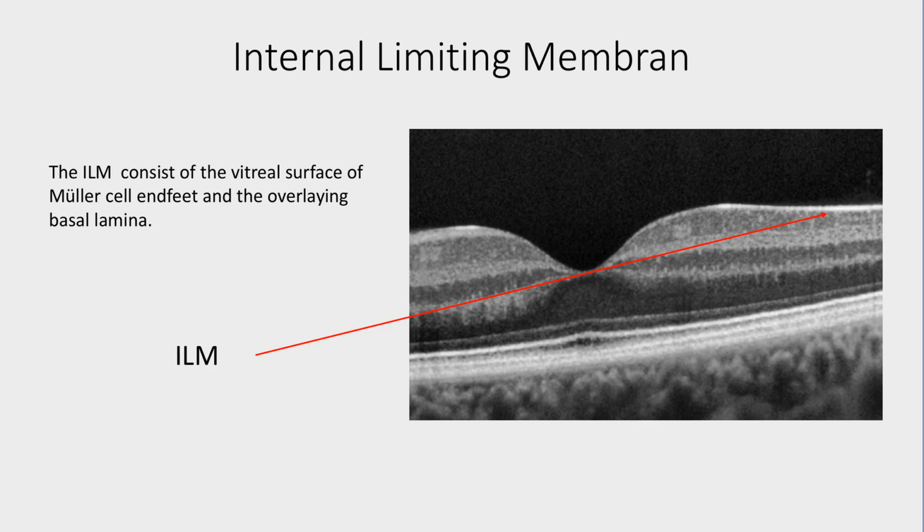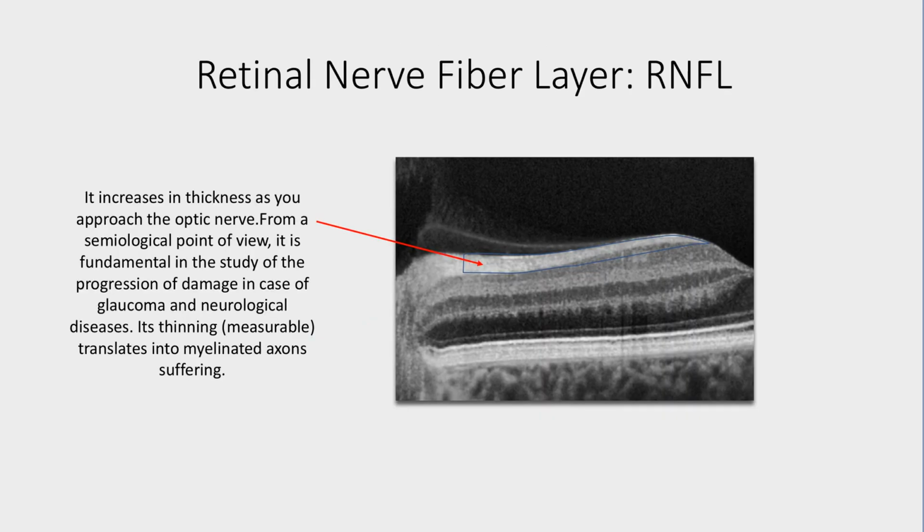Let us now move on to the closer analysis of the individual layers. Here, the retinal nerve fiber layer.